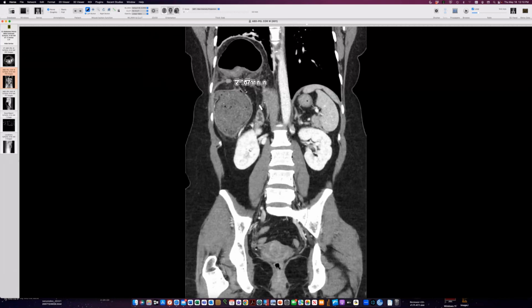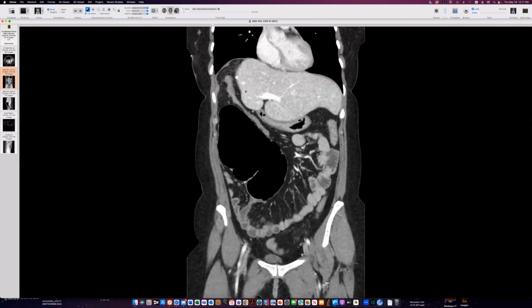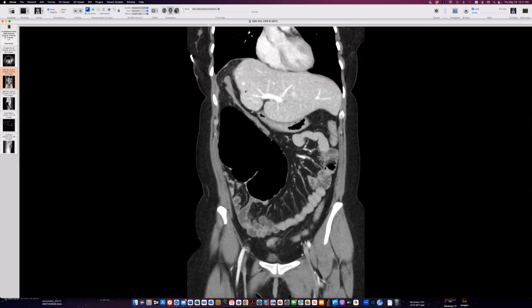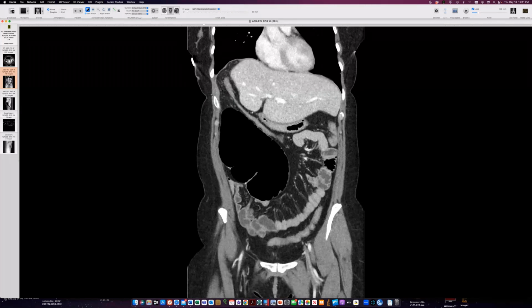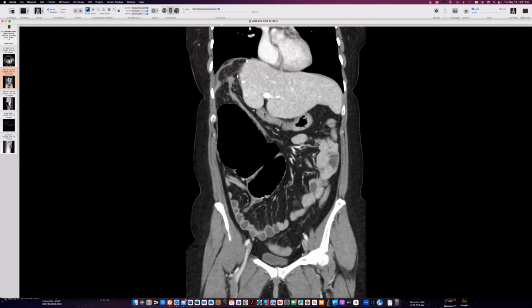And if we scroll around here, we can see why this hemidiaphragm would be susceptible. In the past, the liver, which was complete, went all the way out to the right abdominal wall here, and it blocked omentum and colon from getting near the undersurface of the hemidiaphragm. But with this partial hepatectomy, where they removed part of the lateral aspect of the right lobe, now we have access to this.